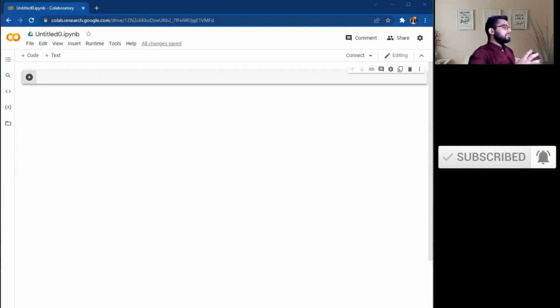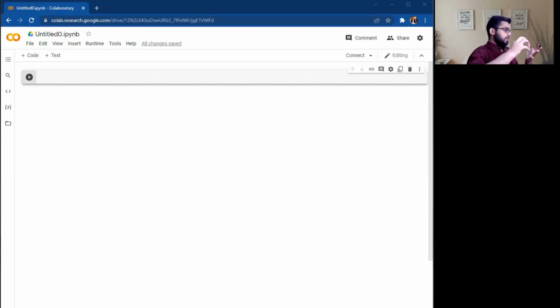Today we are going to implement a very interesting project: we will detect COVID from an X-ray image. Yes, it is very interesting. So let's start. I have made some previous videos on the introduction of Google Colab, how you can upload the data on Google Colab, and how we can use GPU and TPU. So if you want a detailed introduction, you can watch that video.